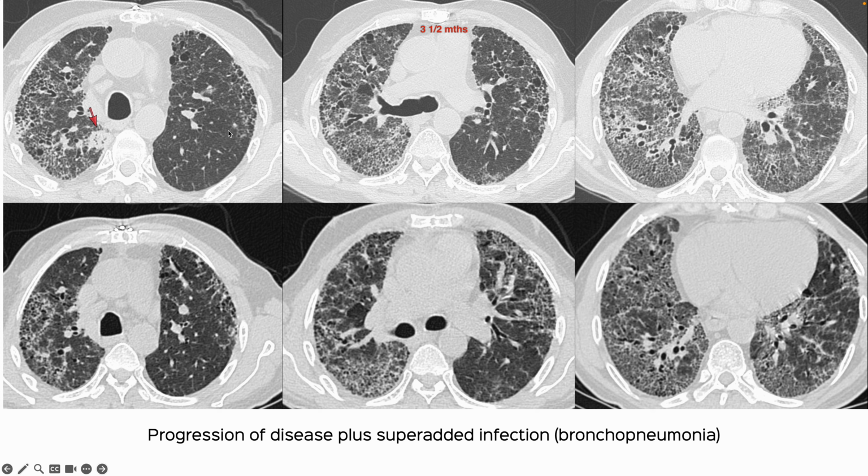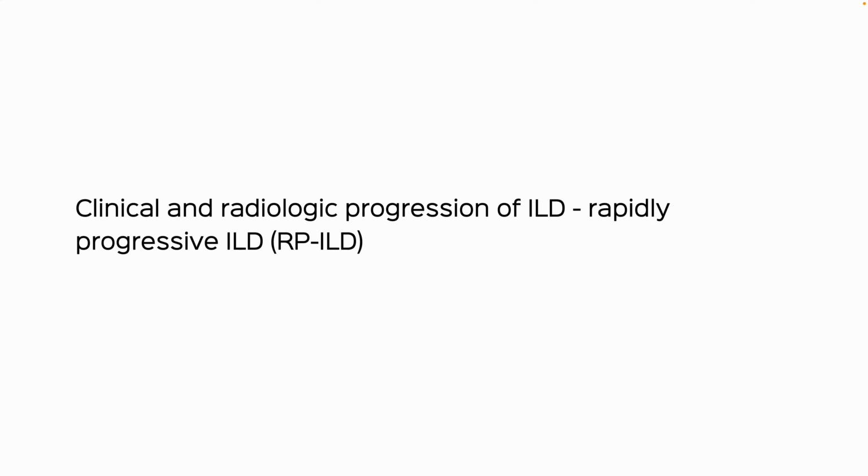And if you look at the three images, I've tried to align them, more or less to show disease, and I think it's more the alignment of the right lung than the left. And so you can see here that there's clear progression of disease. One way to make out is to look at the non-involved secondary pulmonary lobule lucencies. You can see here that all these areas are now involved. There is some bronchopneumonia here, a little increased density here, so there is some superimposed infection as well. But there is clinical and radiologic progression in 3 months.